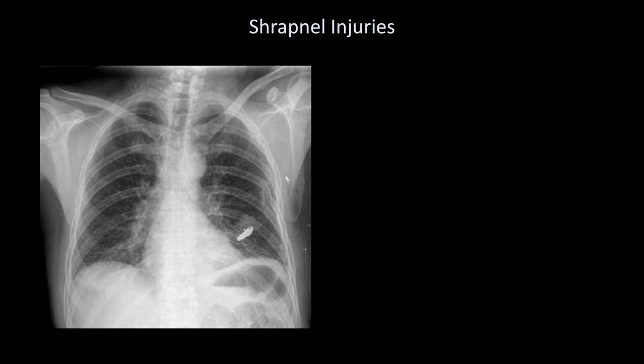Depending upon where you practice medicine, another soft tissue abnormality that may be seen from time to time is shrapnel injury. Here's an x-ray of an acutely wounded soldier. We can see that there are a number of small metallic objects that have penetrated his body on the left side. This one here is clearly extrathoracic. However, what about the largest one? Where exactly is this fragment?